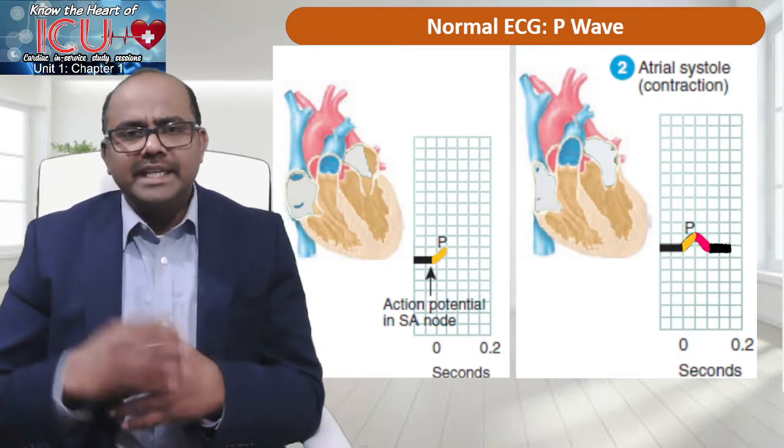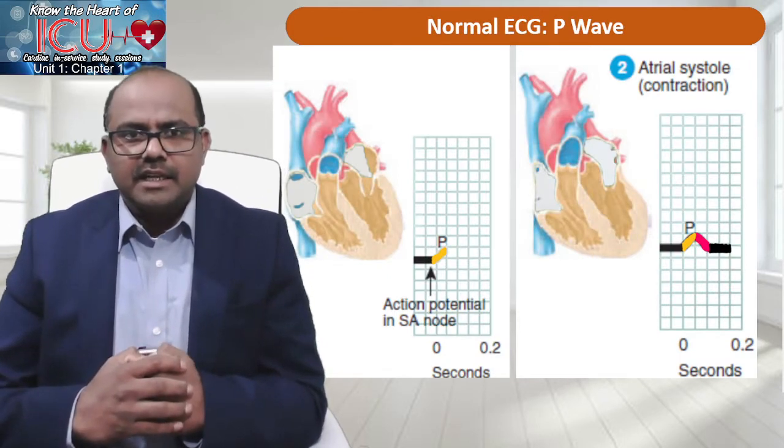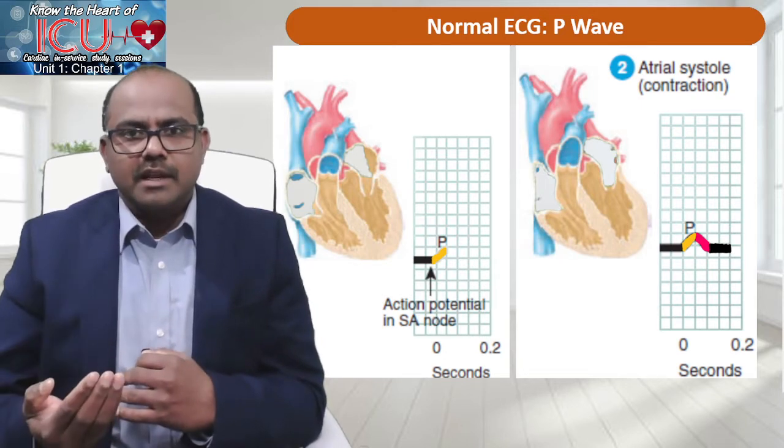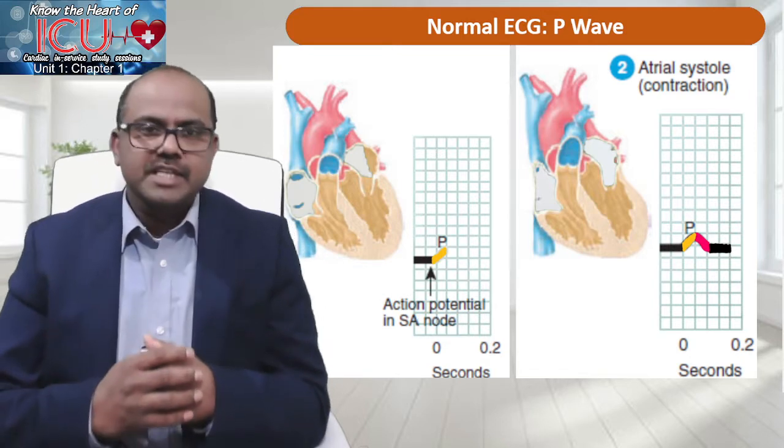And how the ECG is formed, and which part of the ECG represents which part of this conduction system or which part of the myocardial electrical activity.